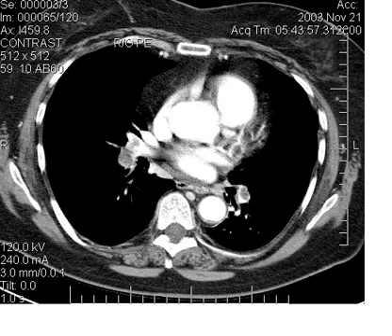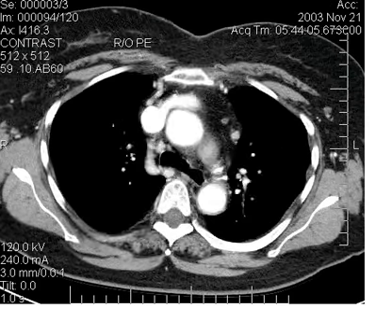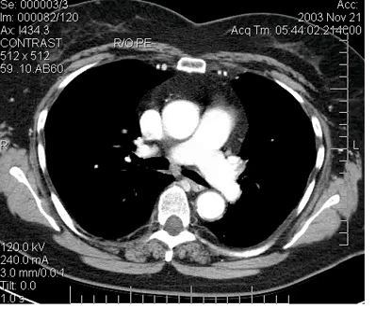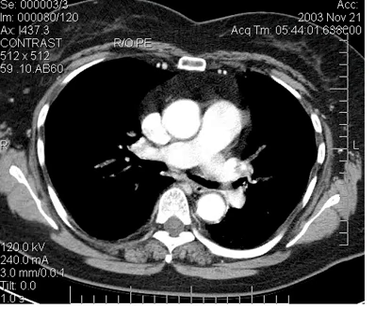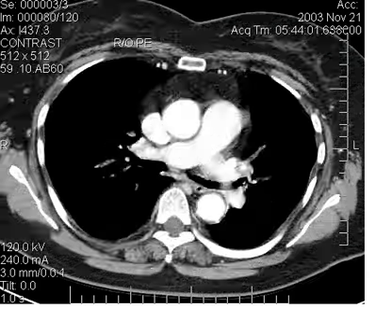Now let's go to the left main pulmonary artery, back to our origin here. We're under the arch, ascending and descending aorta, main pulmonary artery going to the right where we've already been. Now we're going to look at the left and look at its branch points. And as we go down, it doesn't jump out and get you quite as much, but you can see right here, even though it's suboptimal, there's a little filling defect, has that tubular kind of character. And that is a pulmonary embolism.